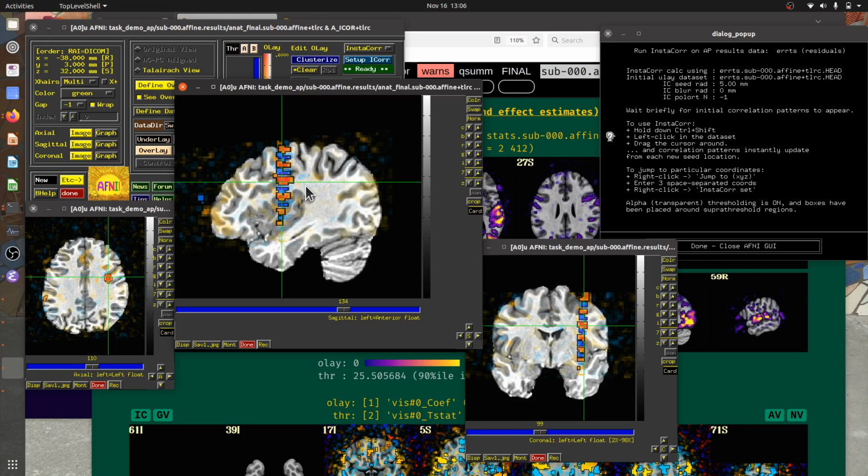And so there's a lot more we'll say about this in other discussions too, looking particularly at resting state data, where our entire analysis depends on spatial correlation. This is a spatial temporal correlation artifact injected into the data in many parts of the brain, and it's extended across a lot of the parts of the brain. And where we have more subject motion, it gets entwined with that, and it's really problematic. Probably any resting state data you see this in is maybe unusable.